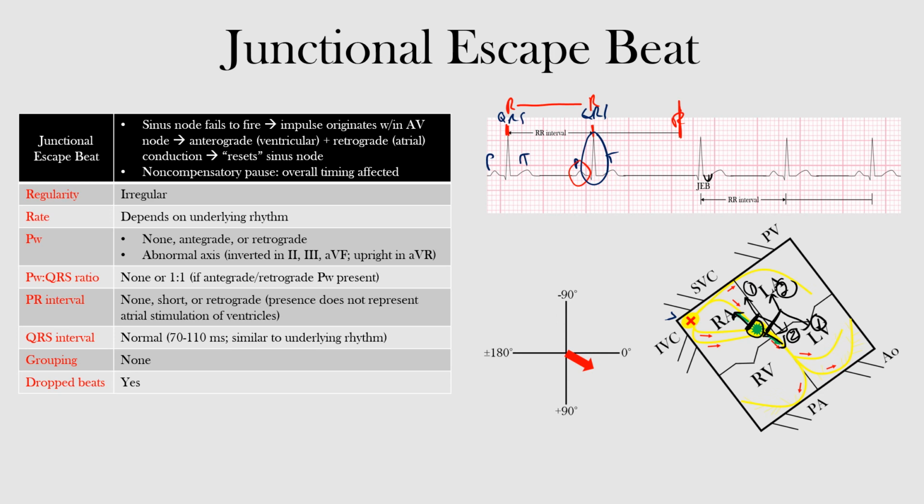Okay. Now, as we previously mentioned, both the atrial and ventricular depolarization occur nearly simultaneously, and because AV nodal conduction makes up the majority of the PR interval, we will end up having a very short PR interval, or at least less than normal, and sometimes it may be even absent. This is due to the fact that the impulse is originating from the AV junction. Okay, so again, remember, the PR interval represents most of that AV nodal conduction, okay? And because we're originating right here, we're not going to really have much of that physiologic delay, and we'll have a short PR interval if it's even present. Remember, it could be buried within the QRS complex, and we might not even have one at all.